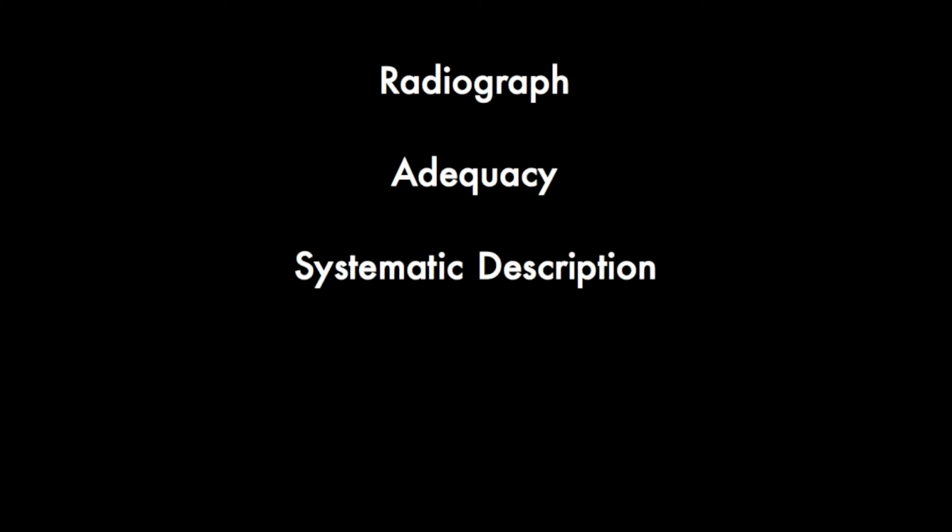Next, one can go about making a systematic description. For example, with a chest radiograph, you may wish to first describe the airways, such as the trachea and the lungs, and then move on to the cardiac shadow and the costophrenic angles, and then any other tissues.